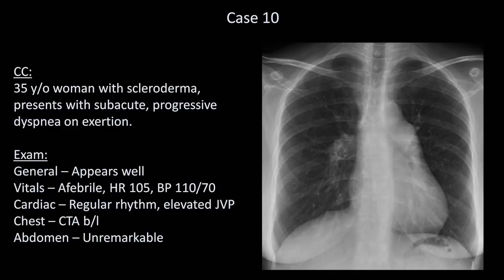Now, so far in this self-assessment, I haven't gone through the other chest x-rays systematically using the A through F system. This wasn't because I don't advocate for a systematic method, but was more out of the interest of time and because it would be a pretty boring video to hear someone else going through the 15 x-rays systematically, especially when the location of pathology is pretty evident with most. But in this case, the pathology is more subtle, so let's practice the system.